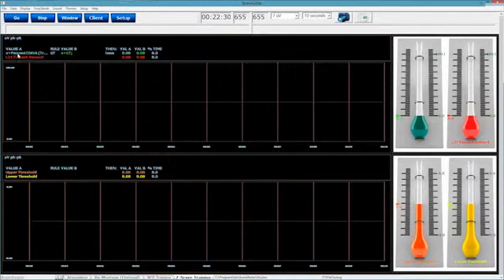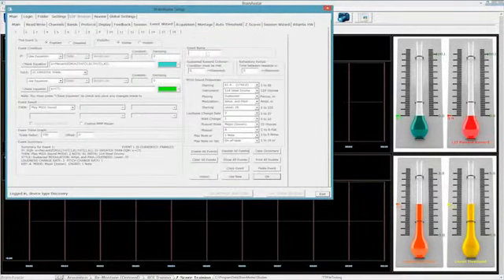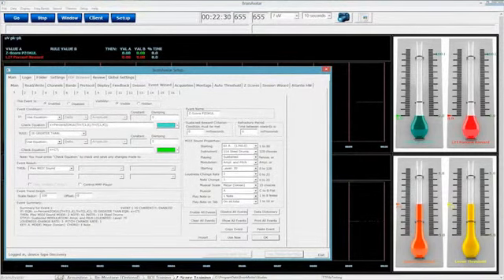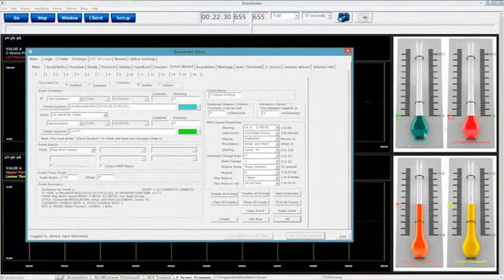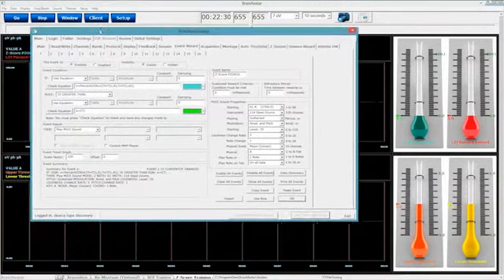All they need to know is that it's Z-score PZOKUL training. That's the reason we put that event name in, because it identifies it a lot easier. It is nicer for thermometers so you can see the actual information, and it's just not as confusing and not as cluttered.